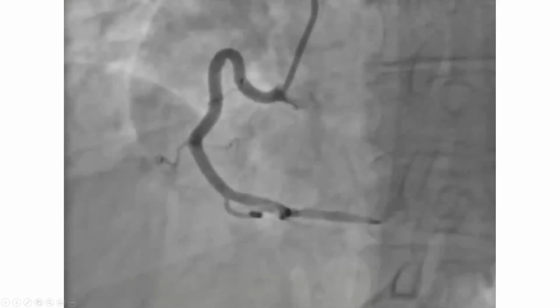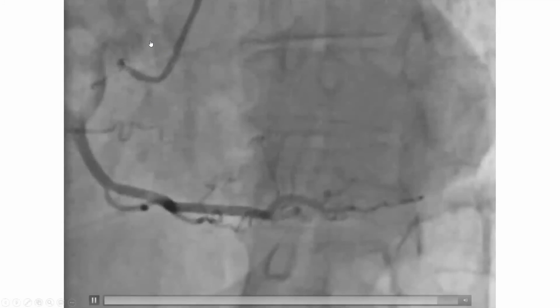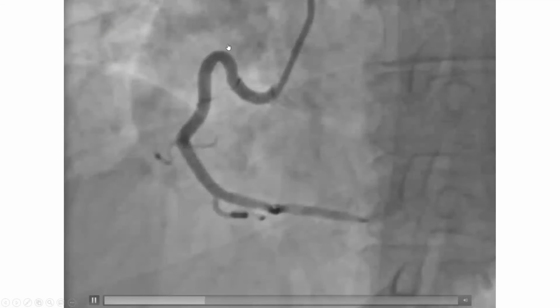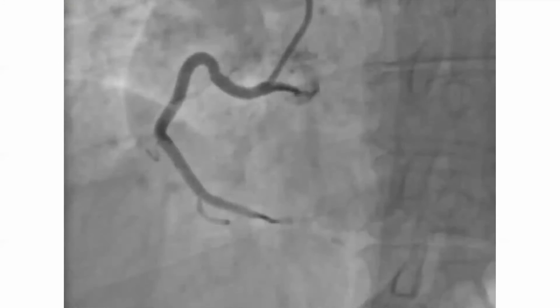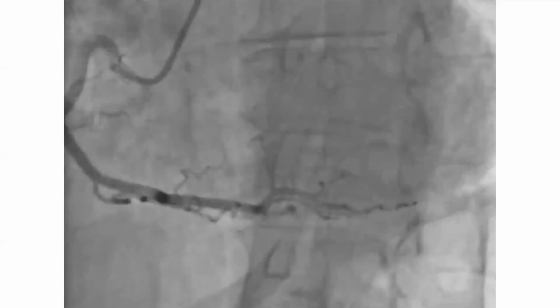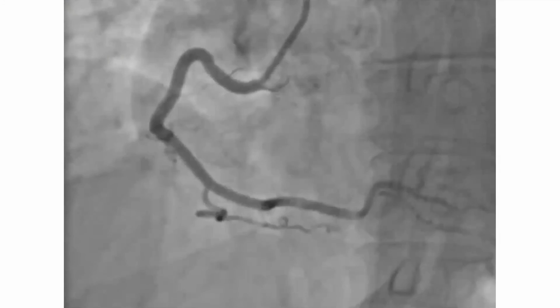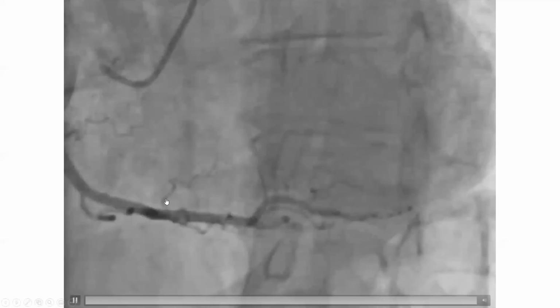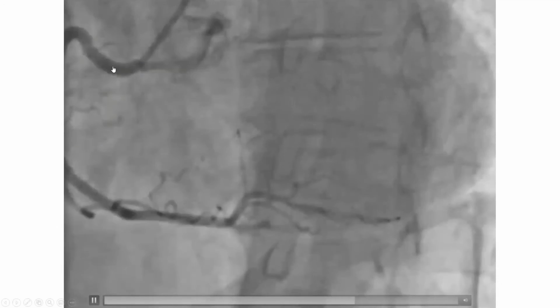And this is an amazing image to me that goes back to a point I showed earlier. Look at that catheter at the proximal RCA. I mean, that artery is dancing around the catheter. And this is how I think that vessel elongation and corkscrew morphology and tortuosity can cause dissection. It's not just a supportive angiographic feature. It can cause dissection. It's like a seesaw and whiplash effect around that tortuosity.